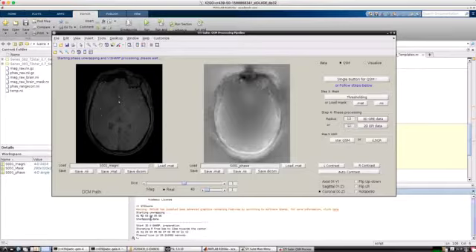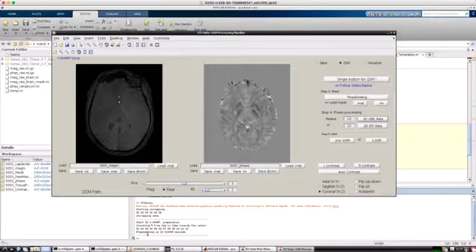So you see that it had done the phase unwrapping, now it's doing the filtering with this V-SHARP method, and it finished in more or less 10 seconds. And it said V-SHARP done, so now we can proceed forward, and we saved some of the variables there.